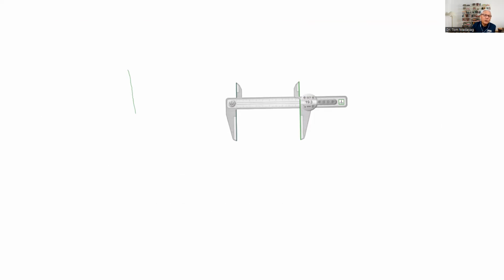So let's illustrate again what I'm talking about. In the situation of a sinus exit block, the sinus fires, but because this particular impulse might be going out through a thickened area of the sinus node, it is unable to get out. And this is what's called a sinus exit block.